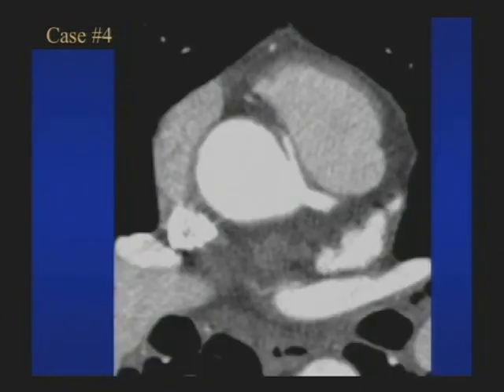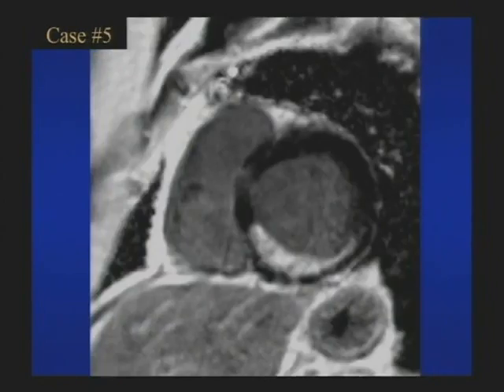Here's another patient with chest pain. Actually, I think this patient's actual history was sudden death. I don't quite understand how they get on the CT scanner with sudden death, but usually it's like a family history of sudden death or syncope or even worse, pre-syncope. This patient actually did have an abnormality. Okay, what's the abnormality? Is it clinically significant? Then what's the potential treatment? And lastly, what kind of sequence is this?